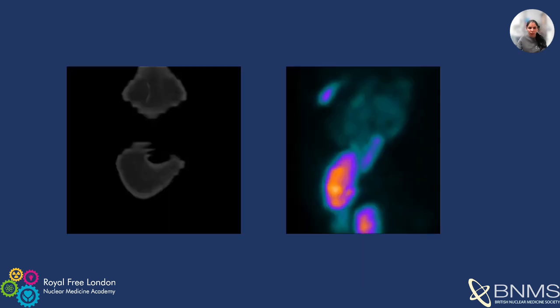So next one, we have a case of urinary leak. The patient had a history of cadaveric renal transplant 10 days ago. So the query was to look for urine leak from the transplant ureter.